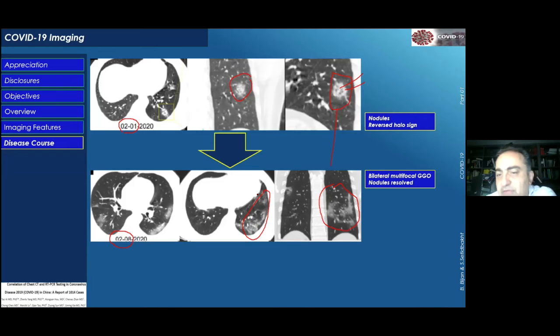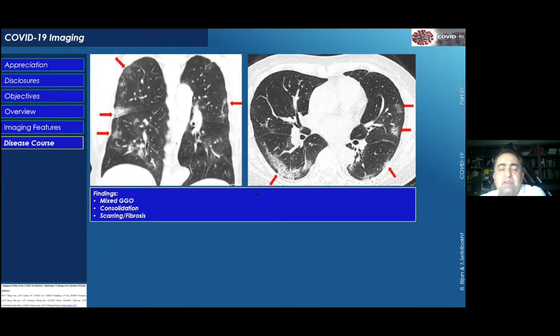We feel kind of comfortable calling it COVID disease, but we know what actually caused this. Whenever they put a picture in front of you, study, try to dissect all of the components one by one, because in one CT you may see multiple different findings. For example, in this one, you see some ground glass opacity areas up here. Then when you get into this area, this is like consolidation. This is a fibrosis. And in one of these cases, actually, the patient had other findings too.